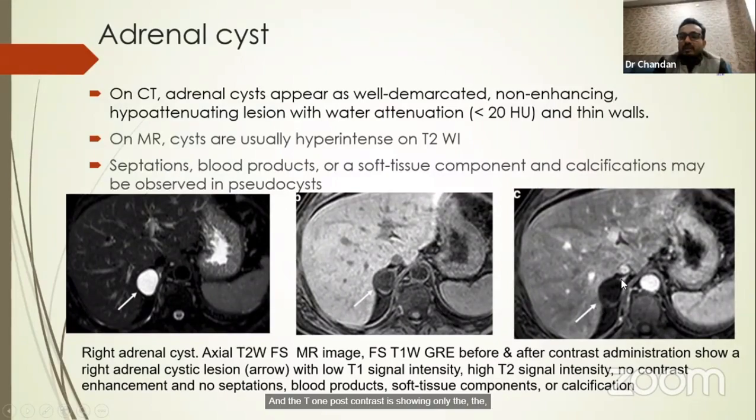The T1 post contrast is showing only peripheral enhancement without a central enhancing area, and no obvious calcification, soft tissue component, or separation of blood product is seen. So the diagnosis is only an adrenal simple cyst.